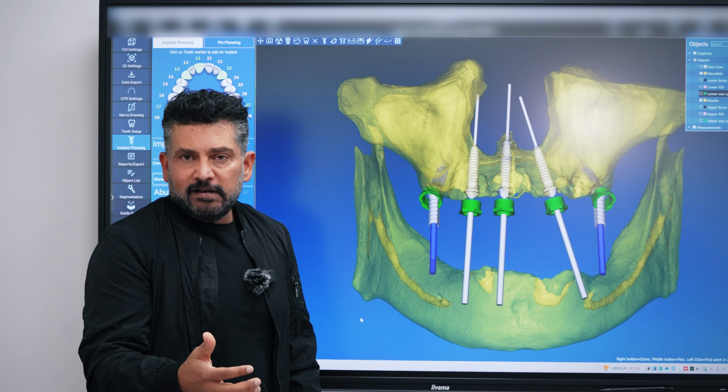The position of the implants in relation to the new teeth that are going on is even more important, because what we need to calculate is the optimal balance of compromises between the bone, the implant, and the new prosthesis. If you have a look, they come out in the middle of the prosthetic. This is very, very important, because then the engineering of the actual prosthesis itself is far more integral.